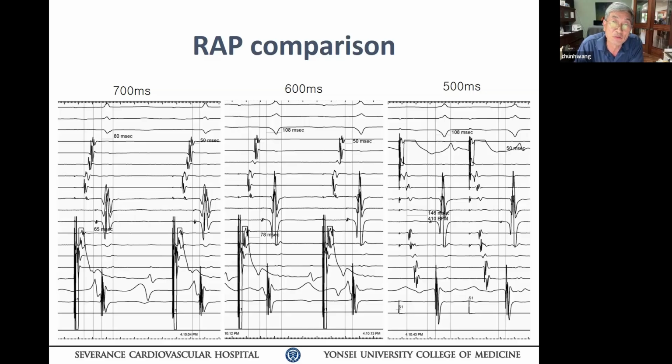Because if it were a node ventricular pathway, somewhere in the ventricular septum got activated earlier, and I'm assuming that's where the His bundle is, maybe your HV should be shorter because the septum gets activated earlier, right? But it's not convincing here. Your measurement is 50, 50, 50. So I said, wow, that doesn't make any sense to me. So think about that, okay? Next.